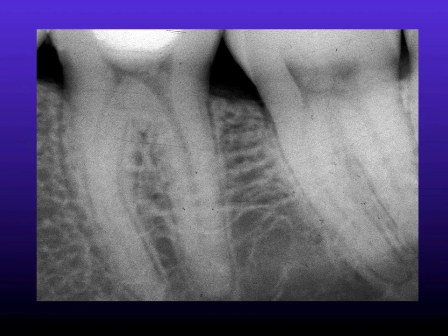One very variable feature on dental radiographs is the trabecular bone. Typically, in most patients, this will have quite a lacy structure, and between the roots of lower molars you may often see almost a step-ladder effect. This is fairly normal. Compared with this, lower down in the jaw you may see a more radiolucent appearance, and this is because in children at least, this is a site of bone marrow production. In adults, the relative radiolucency usually remains, and it's just containing fatty connective tissue.